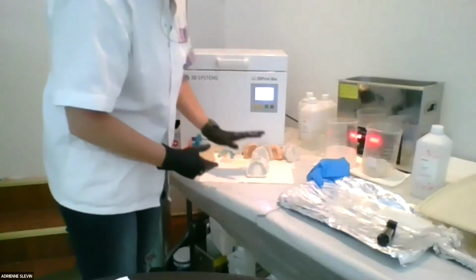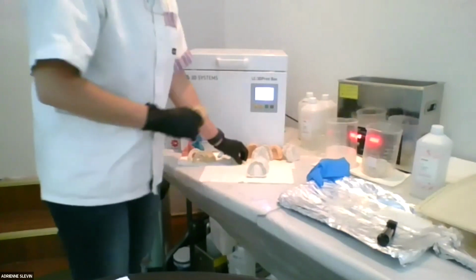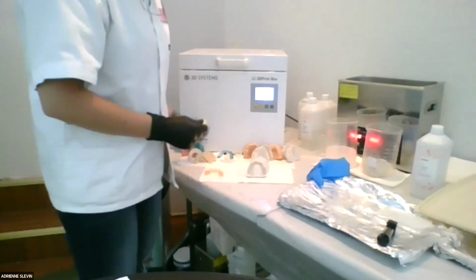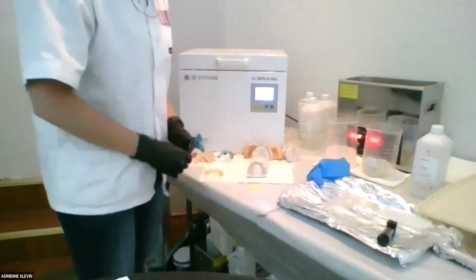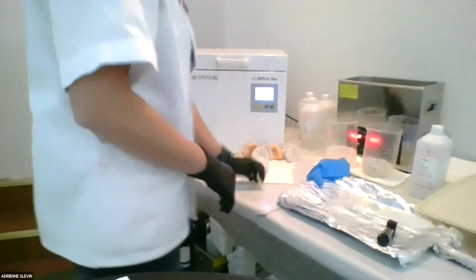So something I like to do is after everything dries, and again, it's very important that you dry. If you are to post-cure a surgical guide and it's not completely dried, or a splint, or anything, your MFH, you could cause microfractures that you don't even see. And so you'll drop it and you'll say, why did it break? It's because that alcohol was boiling in there when you had put it in your oven. Okay, so you caused microfractures.